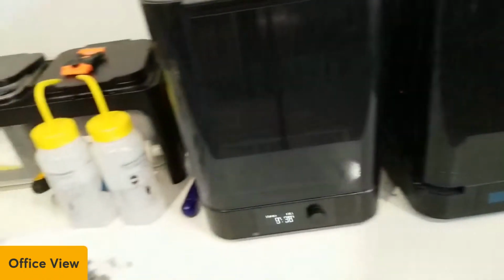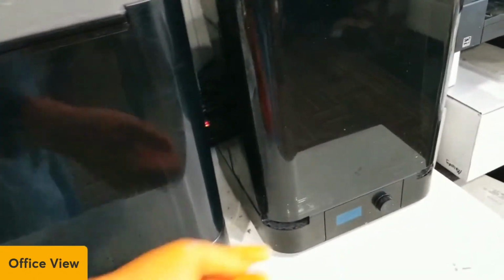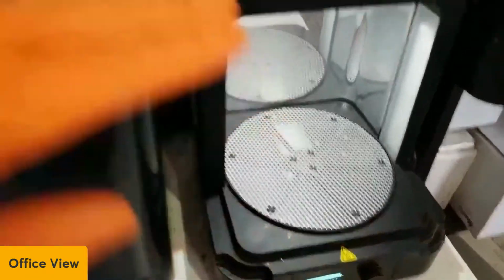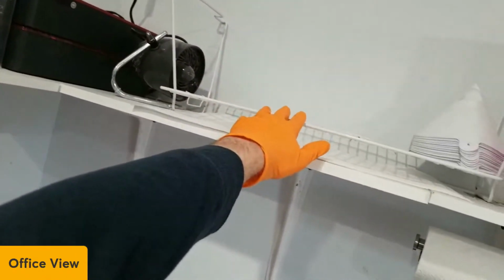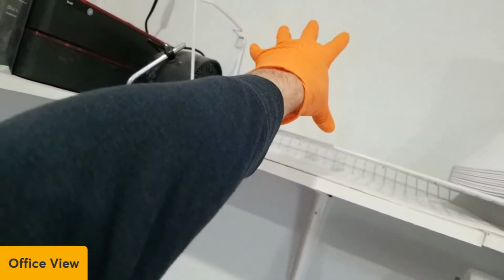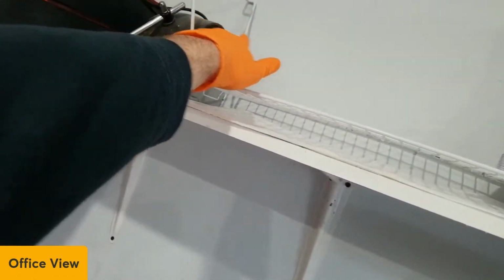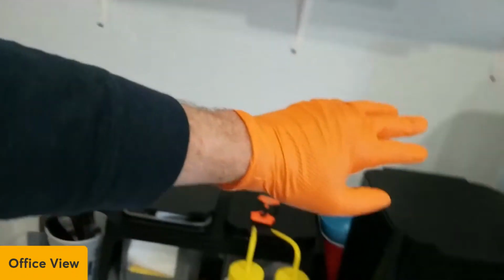Now, while I have this handheld out here, this is my Form Cure. So it's the same size. They kind of look the same. And this has, you can see it's all mirrored in here, and it's got LED lights in the bottom too. It's got this little tray. Take the tray out. And so when they come out of here, I actually dry them up here with this fan. And Perry, the question you asked, I'm going to put a vent right there, like a bathroom vent. And that's an outside wall, so it's just going to blow it outside. But right now, I just have some air blowing over the isopropyl alcohol to help dry the models. And we'll get to that point in a little bit.